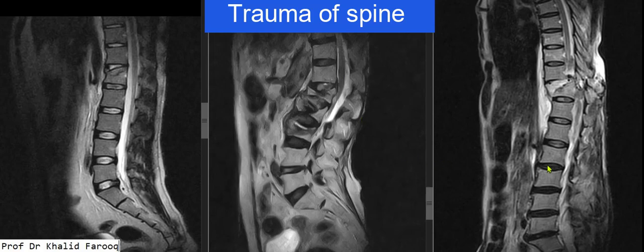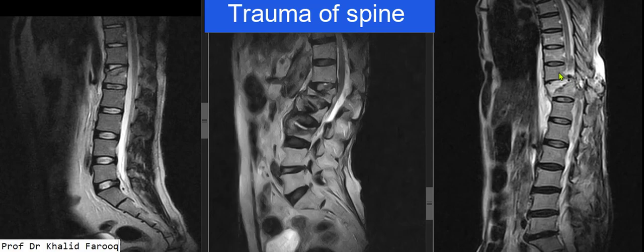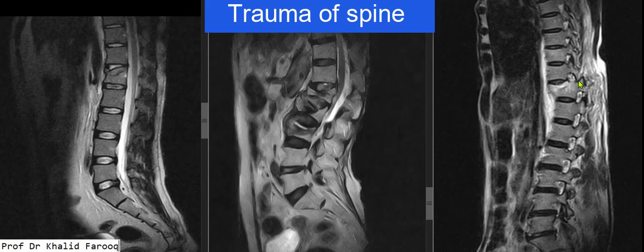Here we can see this is a case of acute trauma, although patient is 60 years old, but we can see soft tissue edema is appreciated in pre and paravertebral spaces anteriorly and posteriorly, while we can see there is bone bruising in D8, 9, 10 and 11 vertebrae with wedge compression fracture, and there is anterior displacement of D10 over D11, suggesting grade 1 to 2 spondylolisthesis with bilateral facet dislocation and facet locking.